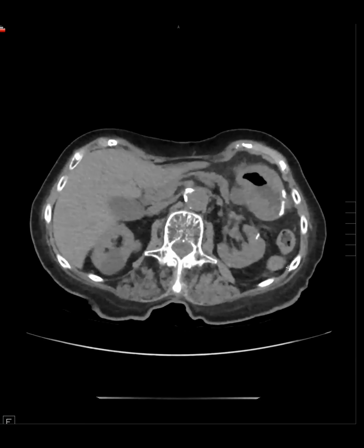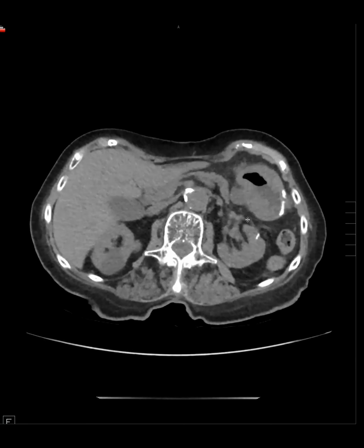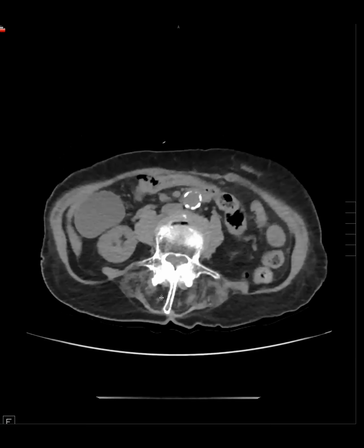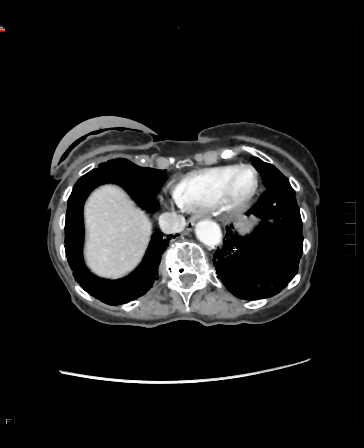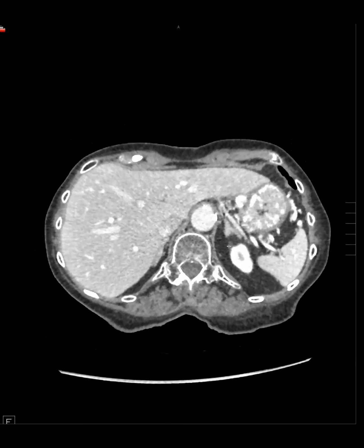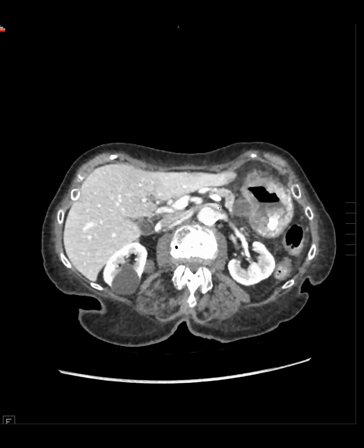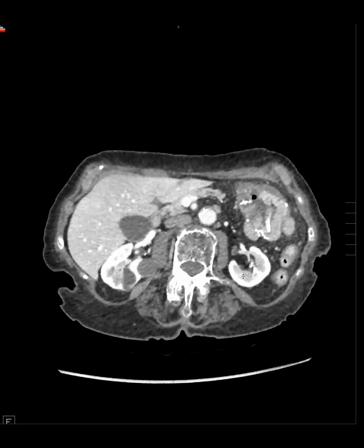And then the patient had a subsequent contrast enhanced CT. So that was mentioned, this finding, the other, and then this renal isodense lesion. So the patient got a CT abdomen and pelvis to evaluate those findings. It was a multiphasic study, and the thing in the stomach wasn't enhancing. To me, it looked like a marginal ulcer, or it looked very fluidy, and it doesn't enhance on multiphasic study. So I thought that was not malignant appearing.